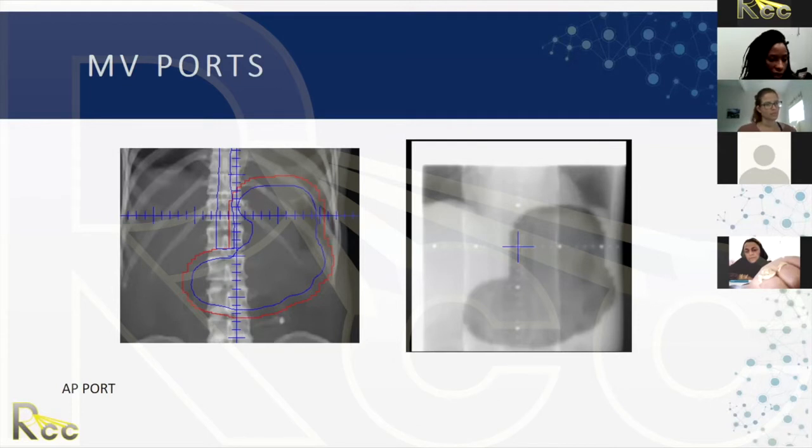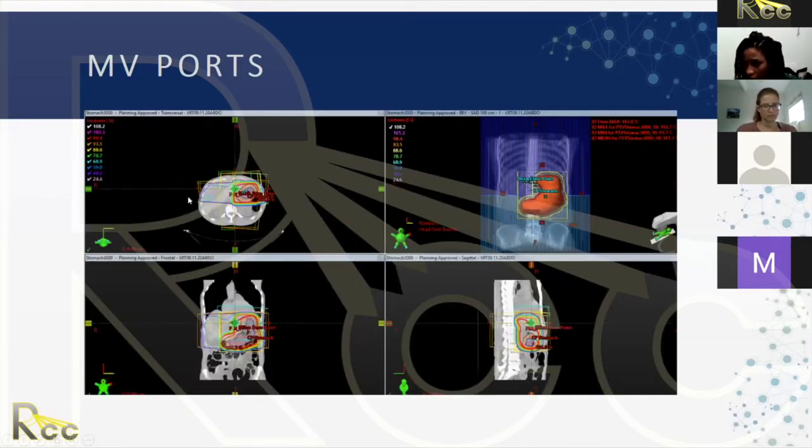We also have these graticule systems that you can use to essentially count to make sure that your MLCs line up where you want them to line up. So this is the graticule system here. I was mentioning the gas bubble, so you can see the gas bubble right there and gas bubbles right there. So I know I'm in the general vicinity. You can kind of make out the dome of the liver right there, right? The diaphragm, the dome of the liver, and you see that same thing on this side. And I know that the heart was right in that picture on the prior slide.